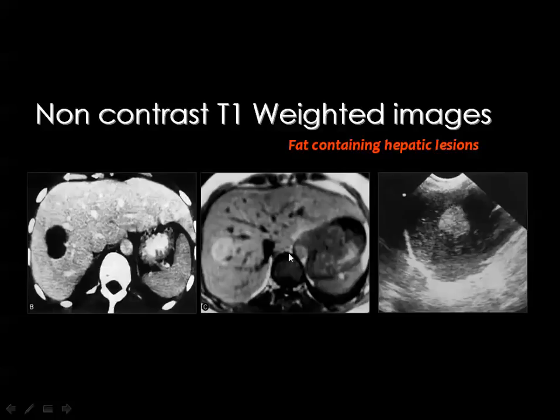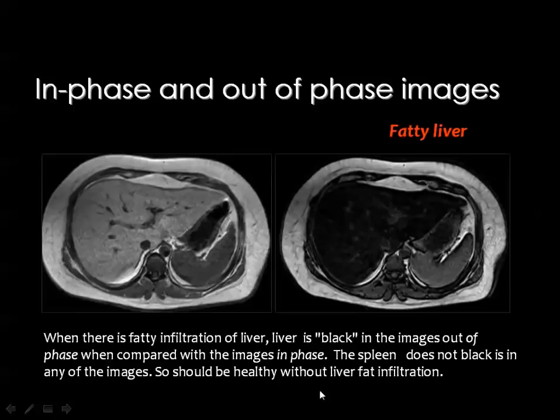And in MRI, you can see that the fat in the T1 weighted image will be of bright signal, and if you have a fat suppressed sequence, this signal will be suppressed as well, confirming that it is made of fat. Then the in phase and the out of phase images are specific for the diagnosis of microscopic fat, the fat which is not seen by the naked eye.